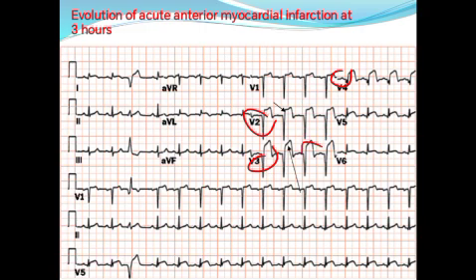And we have some ectopics here. This is ST elevation myocardial infarction. You can say anterior septal, involving the anterior and septal leads, and also lateral. If you look, there is elevation in the lateral leads. So this is very extensive. AMI lateral leads means it's involving lead 1, AVL, V5 and V6. So this is a very extensive anterior septal and lateral myocardial infarction.